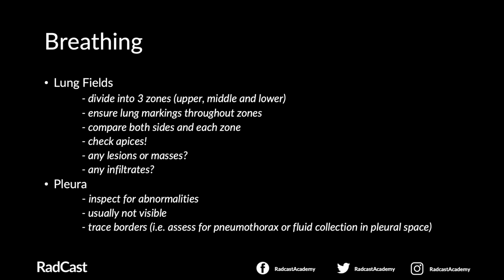Let's move on to breathing. What are we going to assess in breathing? Firstly, we assess the lung fields. We can divide these into 3 zones, the upper, the middle, and the lower zones. And we need to make sure that there are lung markings throughout the zones. We must compare both sides and each zone at a time.